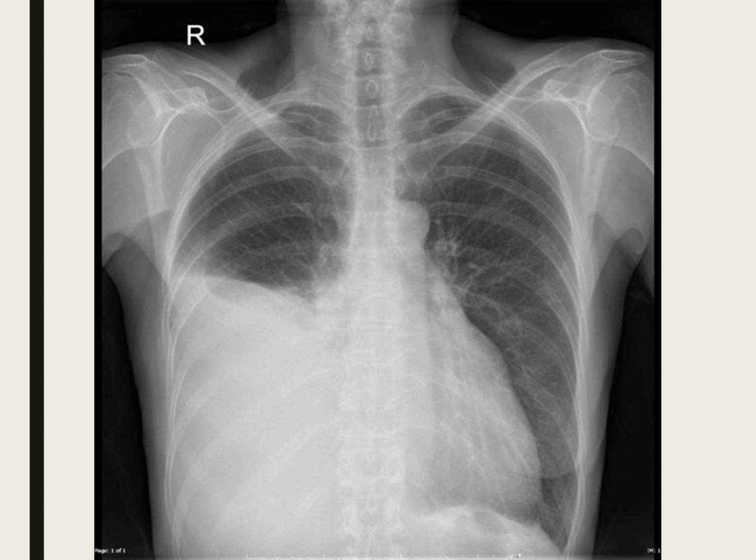So, A wants to talk about the airway. Well, let's start from the beginning. We identified the patient, it was the right patient, Mr. Smith, it was done just 5 minutes ago, that's fine. It says right side on the right, so we presume it's right. How about the exposure on this X-ray? It's actually really good. When you see the vertebra going down, I can see the vertebral spaces all the way down. This is a perfectly exposed X-ray.